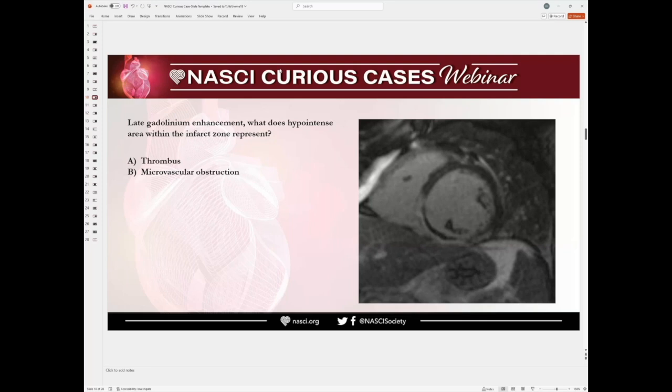So yes, especially in this case, I will just try to draw something. For this case, we know that there is no myocardial thinning yet. This is acute or subacute MI. If you follow the endocardial contours like this, you know that the endocardium is likely here. So as Mahmoud said, this area is within the myocardium, not in the intracavitary.